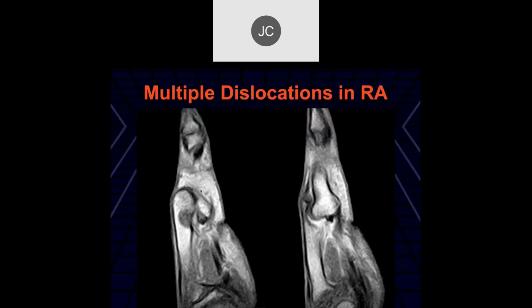And then this is just another example. Here's the metacarpal bone. Here's the proximal phalanx. It's volarly displaced and proximally retracted, and you get a typical deformity of the distal end of the metacarpal, where you get an erosive change from just the mechanical banging of the displaced proximal phalanx against the distal metacarpal.